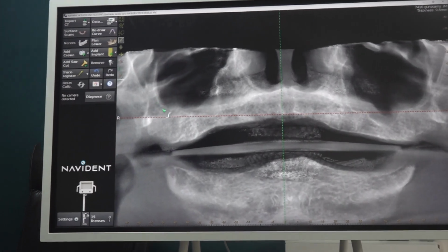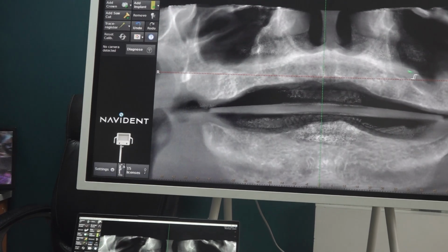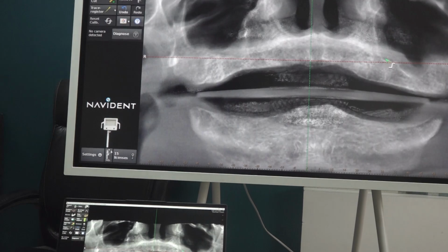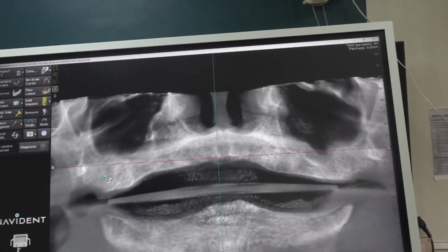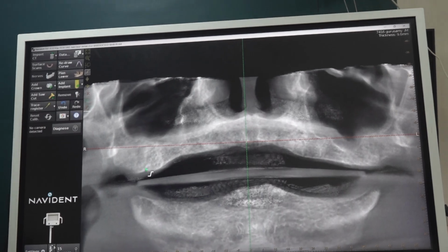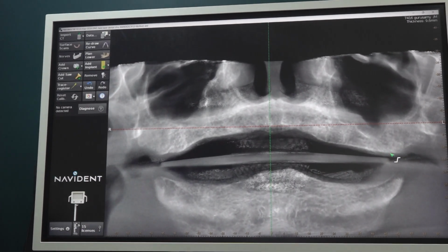So you can see the sinus. The sinus is not expanded distally. That is a good thing. Here comparatively more anterior expansion, mesial expansion, and here downward expansion. But still, pterygoid is safer. Tuberosity is safer. You can see, no, this is a pterygoid junction, but the tuberosity is very much down. But here, this is a pterygoid junction. The tuberosity is at a decent level.